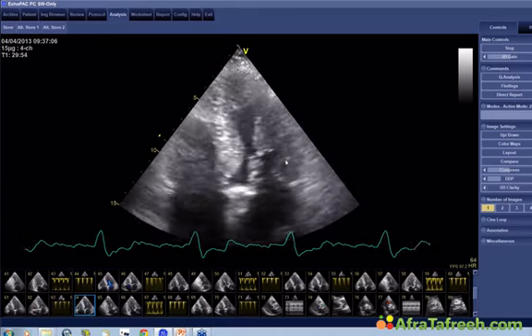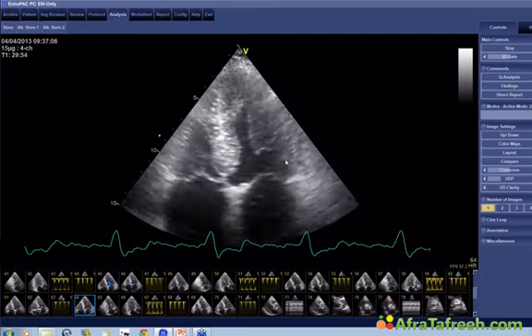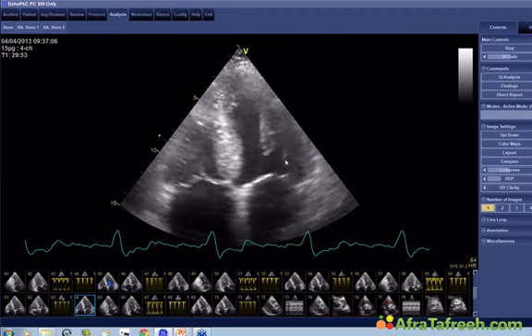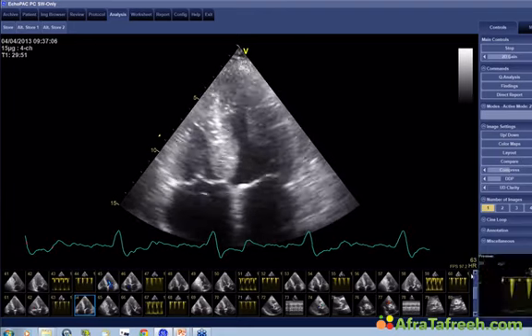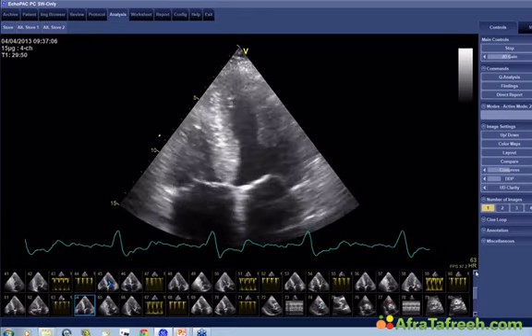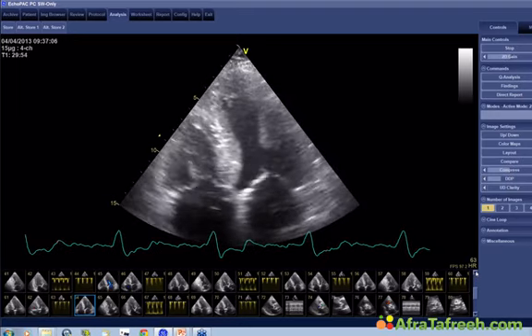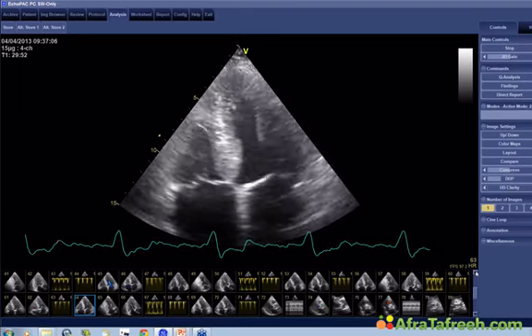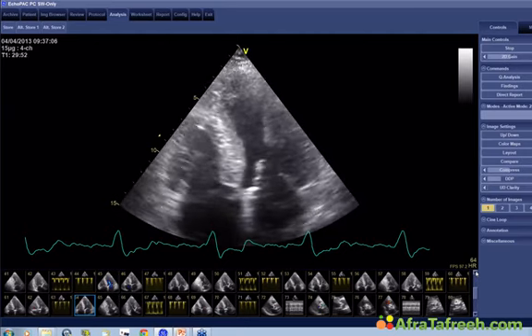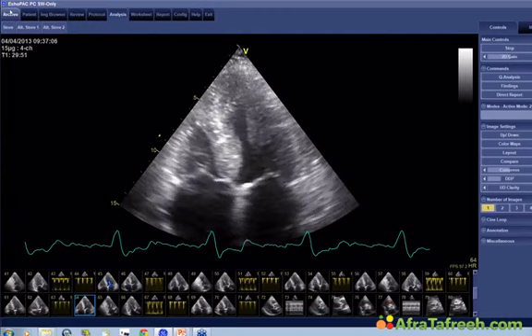Now the object here is to increase left ventricular function to an extent that we are able to generate enough flow to unmask severe aortic stenosis. This, of course, only works if we can stimulate the patient and if there is some form of contractile reserve. If the patient has a ventricle which is completely kaput, as we say here, then we are not able to generate gradients, and then we can simply not come to a conclusion with the test.